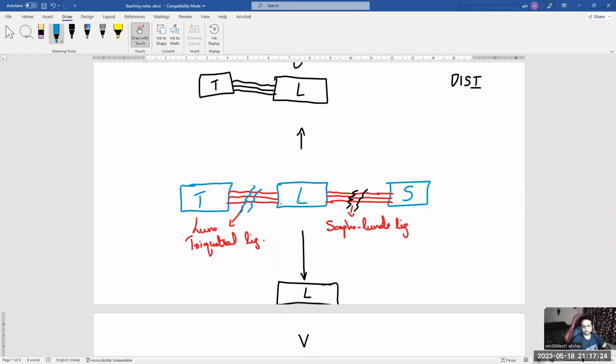Basically, it is tilting that is happening. So the lunate will tilt volar, and along with it, the scaphoid will also tilt, and its scapholunate ligament is intact.